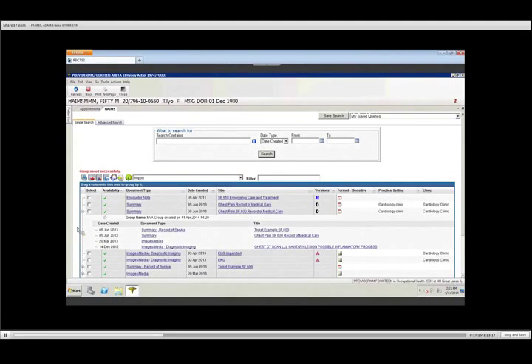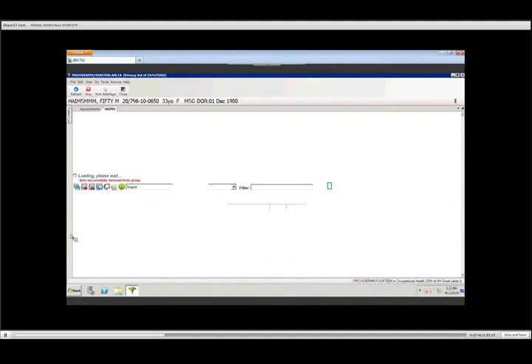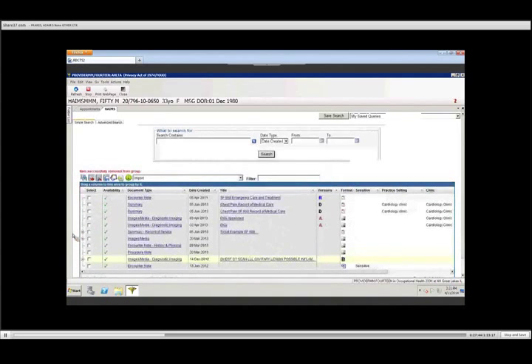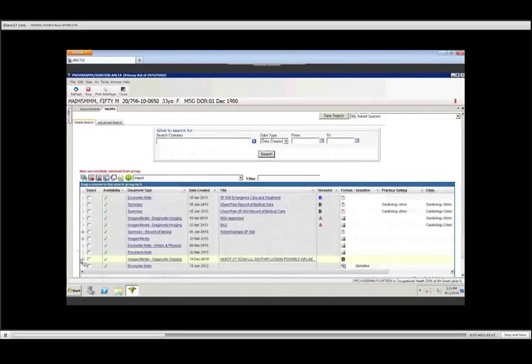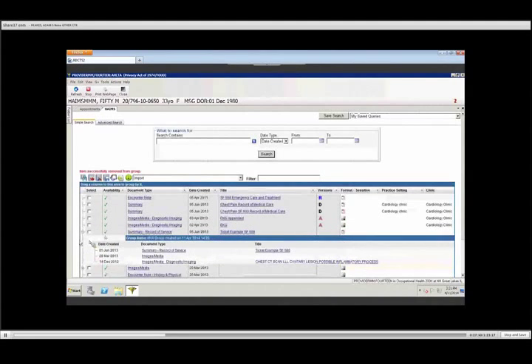And the answer is you can simply click one time, right click. So for example, on this summary, I will right click and it says remove asset from group. And as I click that, it will now take that one asset and remove it and leave me with 3. You'll notice that now I only have 3 plus marks, and if I drill down, there will be 3 assets. So very good. Thank you, sir.